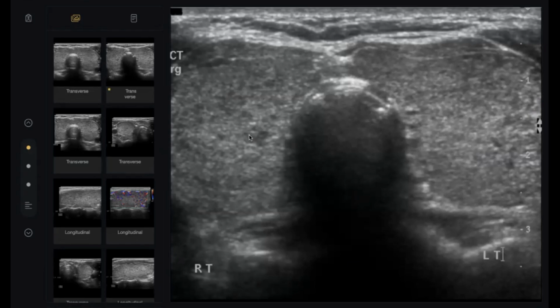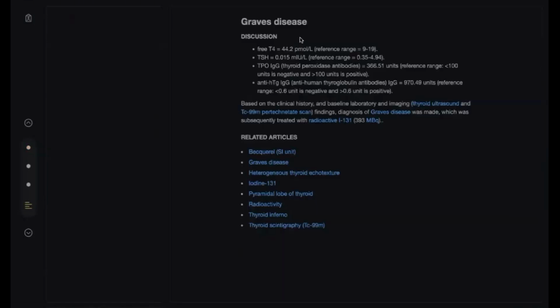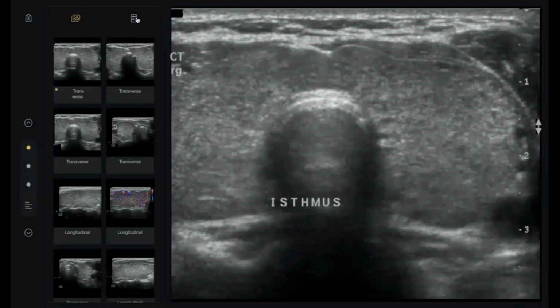90% of the diagnosis in thyroid depends on labs, and all of us know that. Please don't go too deep into dilemmas beyond the scope of our target. Okay, my colleague, I agree with you. It may be thyroiditis, but finally we follow Radiopaedia. It is Graves.